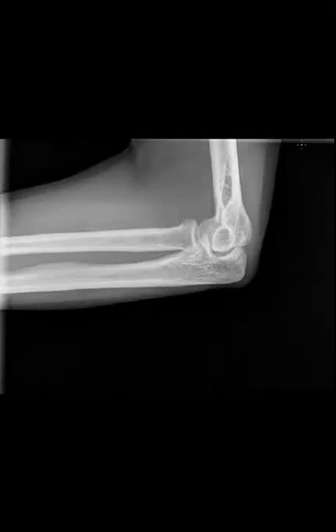So here's the lateral projection of the elbow. You can tell we're looking at the elbow from a lateral perspective. Humerus, radius, ulna. Now this is a great example of what I was talking about before, to make sure that the radius and ulna are completely separate, and as you notice here, there is quite a bit of space between them. There is an interosseous membrane that lives in this location that holds the radius and ulna together, in addition to the joint capsule created by the proximal radial ulnar joint, which lives in this location.